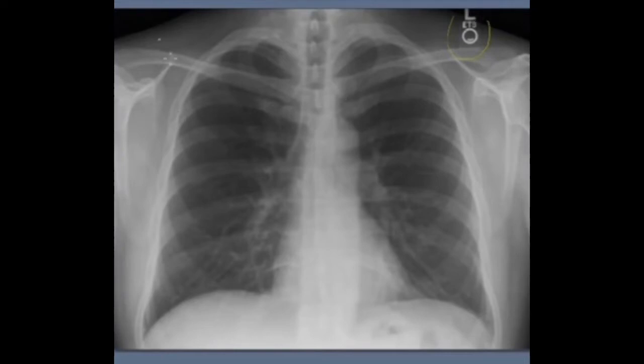So the first thing that I like to do is I like to do A first. A is the trachea. I like to look for the trachea. As you can see, it comes down in this area right here. Okay, and then notice that it branches this way, and if you can make it out, you can see it branches this way and down like this.